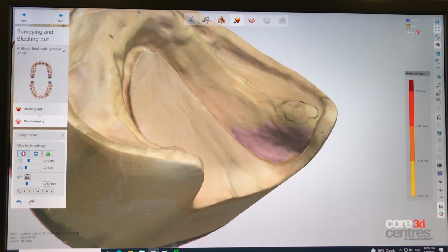Maybe in this area here, I can increase the thickness of the sculpting tool, and you see what happens there, right? It adds a lot and a lot and a lot. And now if I went too far and I want to reduce it, I'll just go back here and select the negative icon and start taking it away.